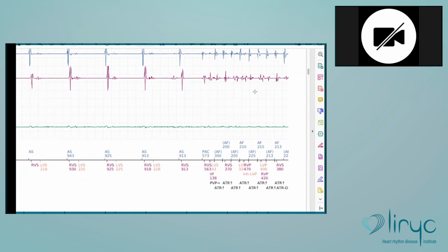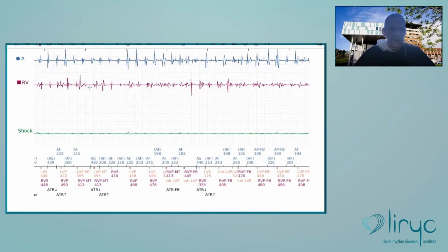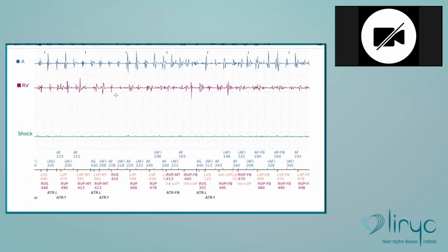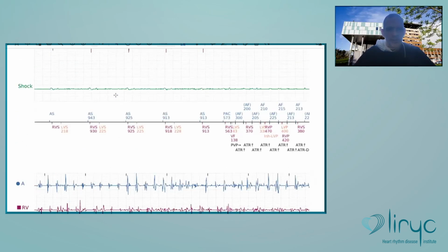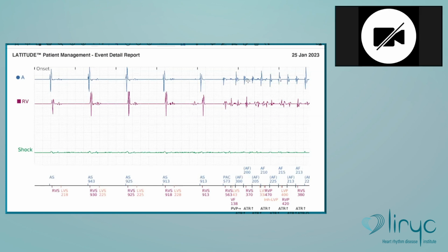Could be oversensing. Oversensing of what? External noise? Let's consider just this channel, the atrium. You would say it's external noise? No. What would you say?